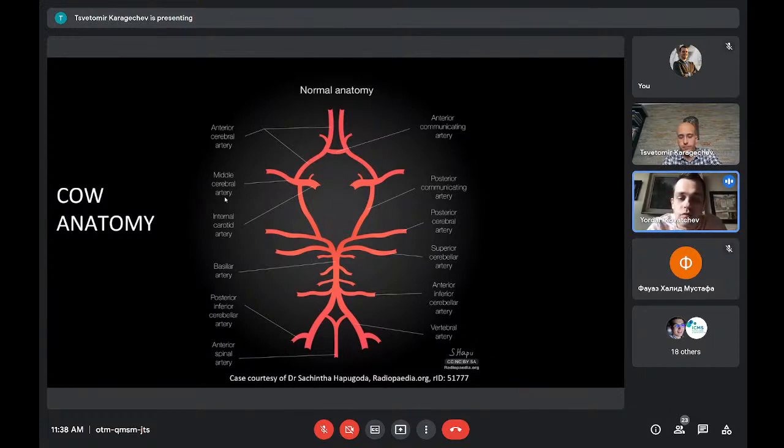It's a continuation of the internal carotid artery, and we call it, just for short, MCA, because I'll show you now. I'll say this is something in MCA here. It means the middle cerebral artery, and it provides arterial supply to a major part of the brain. So you can look at it afterwards to remind yourself of vascular anatomy, but this is the basics.